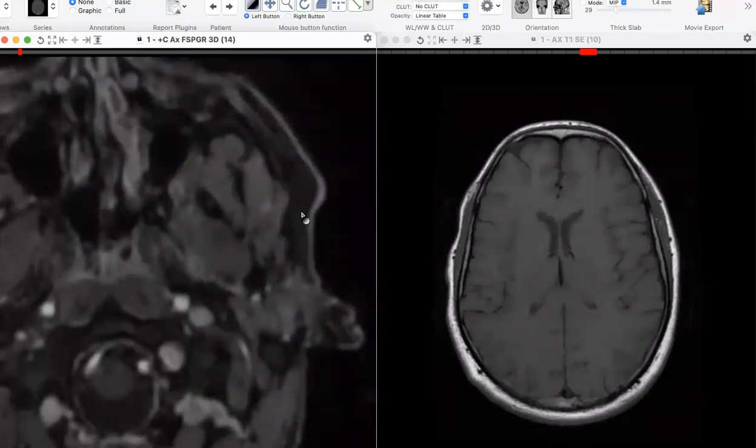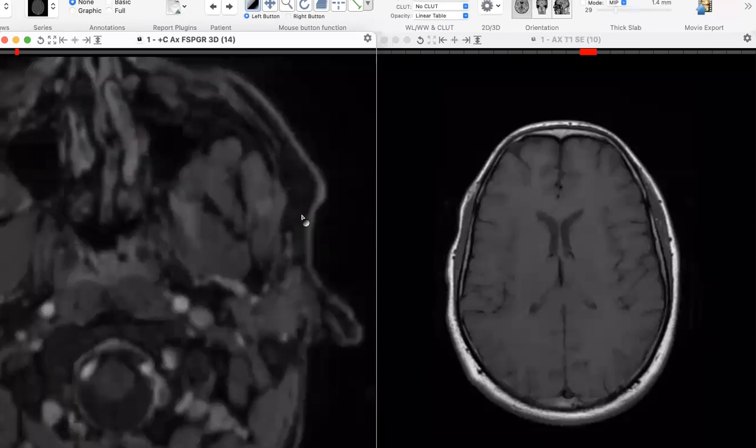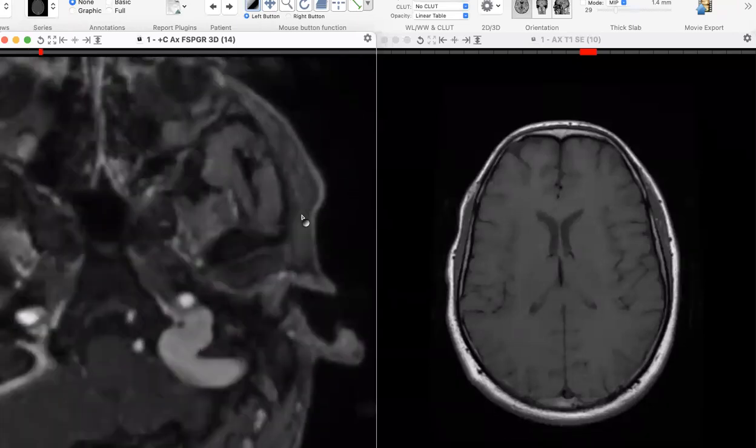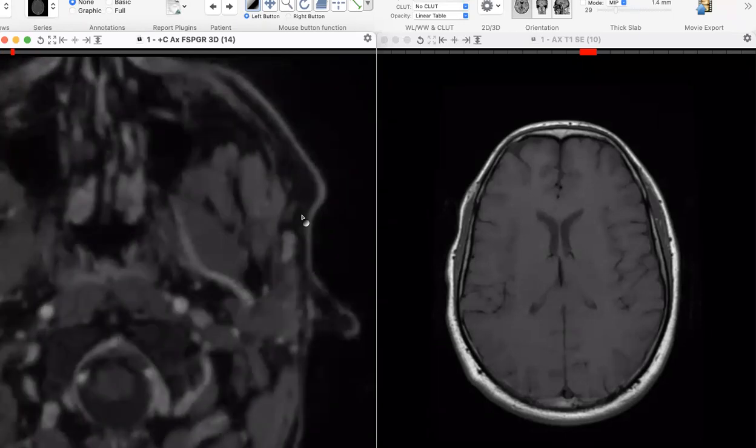And where is it? It is in the musculature, probably the lateral pterygoid muscle. It's the left masseter muscle, but anyway, what do you think of the diagnosis? Sir, if the ring enhancing lesions are there in the muscles and brain as well, then parasitic infestation is more likely. Neurocysticercosis would be at the top of the differential then. Okay.